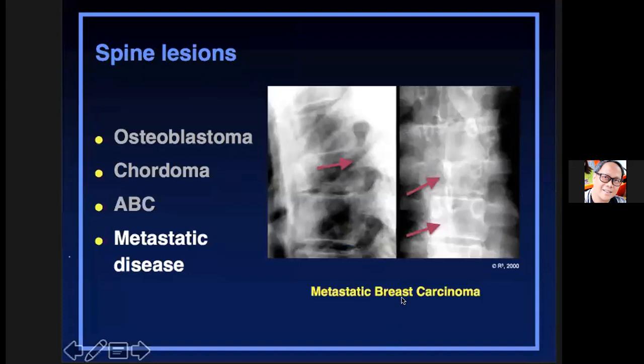So when you are entertaining metastatic lesion to the spine, one area that you again look at is the pedicles, no? When there is infiltration, the pedicle disappears, and it's called the pedicle sign. And that's what you see here. The pedicle of this vertebra is no longer clearly demarcated, while here you have a pair of normal-looking pedicles. Can you see the lost pedicle there on the right?